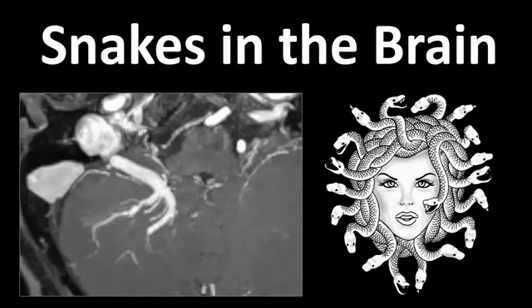And this one as well, snakes in the brain or palm trees in the brain. This is the imaging sign classically associated with developmental venous anomalies, which are congenital abnormalities of the venous drainage. Well, abnormalities more like a variant pattern of venous drainage, which can be considered normal.